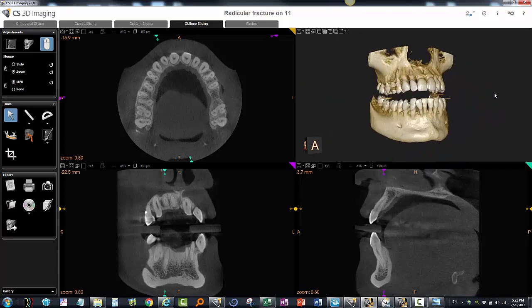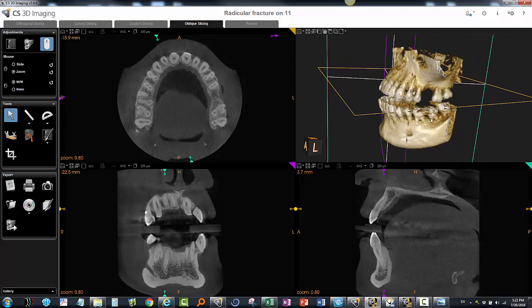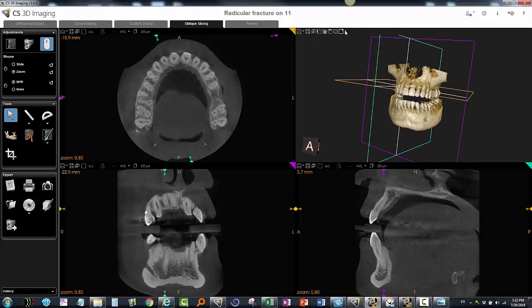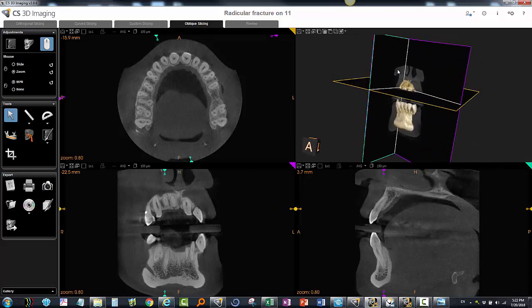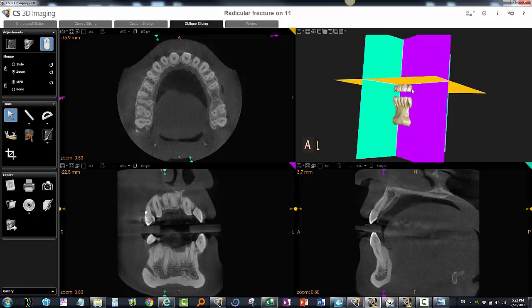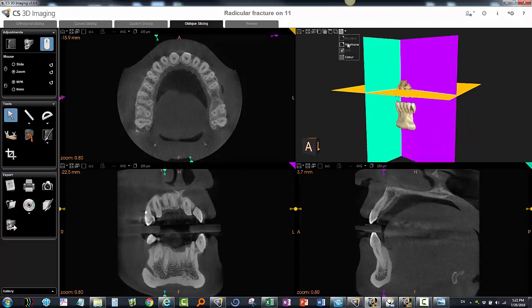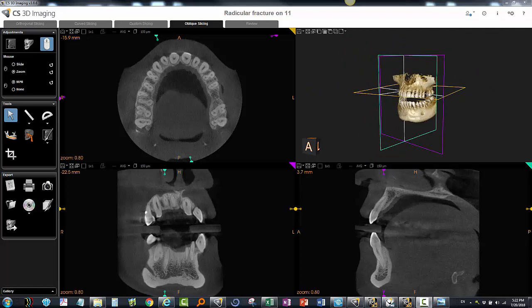So we can click on no planes to completely hide them. We could click on wireframe, which is probably the most common that I see, and it is the default option. We have MPR, which is a little cross between the DICOM data and the 3D rendering. And then we have a color option, which just gives each plane a solid color. I like to keep it on wireframe.